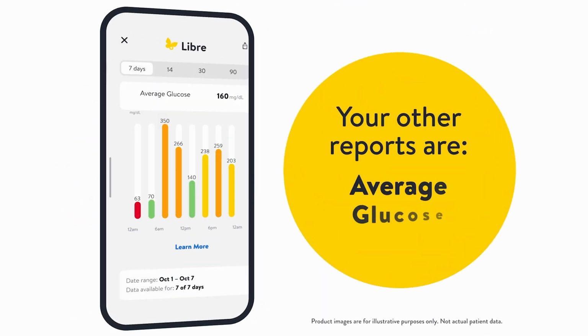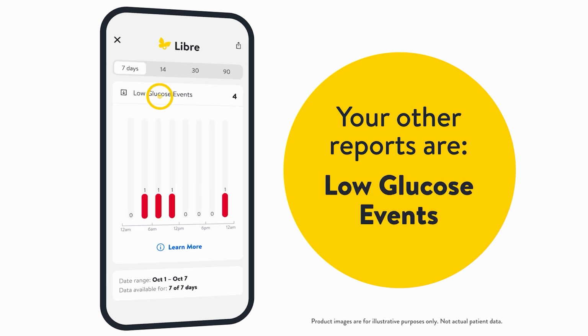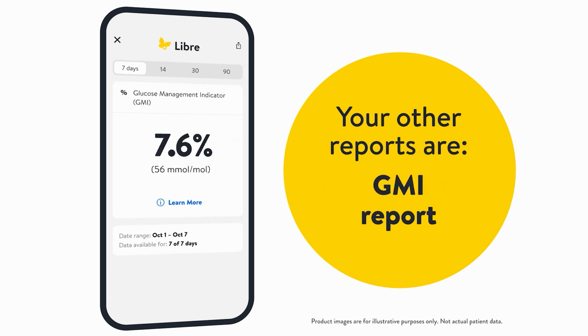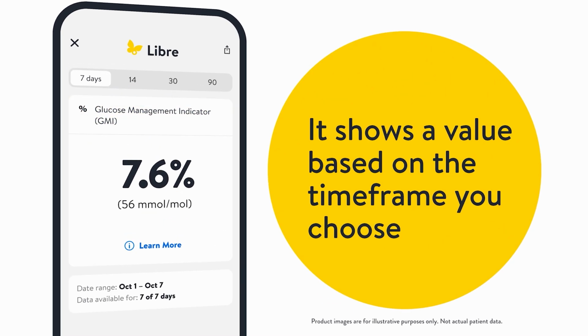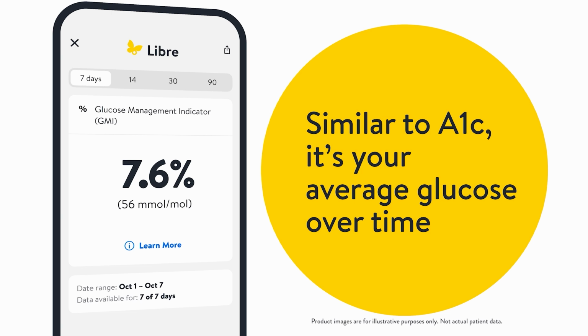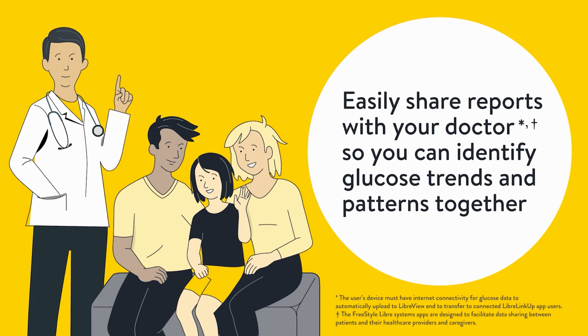Your other reports are average glucose, low glucose events, daily patterns, and GMI report. It shows a value based on the time frame you choose. Similar to A1C, it's your average glucose over time. You can easily share reports with your doctor so you can identify glucose trends and patterns together.